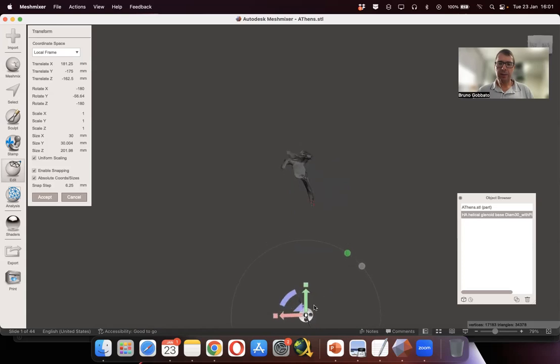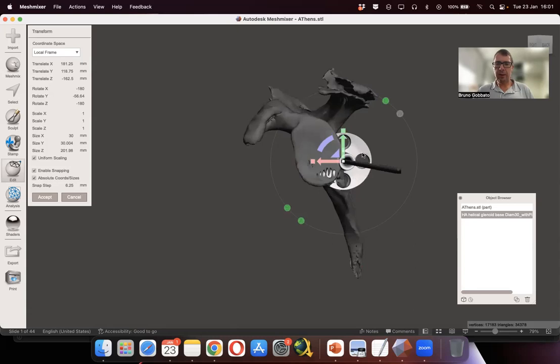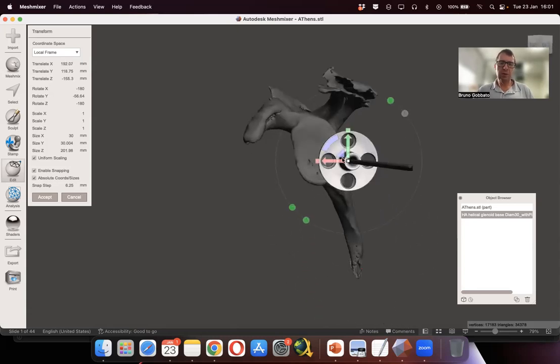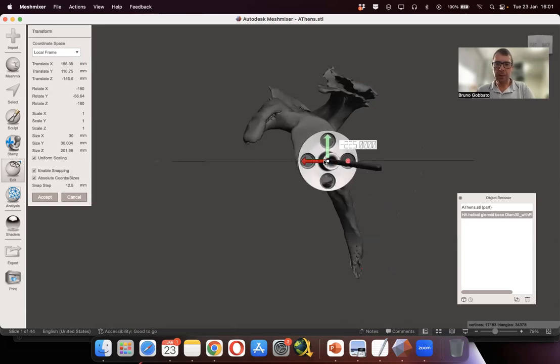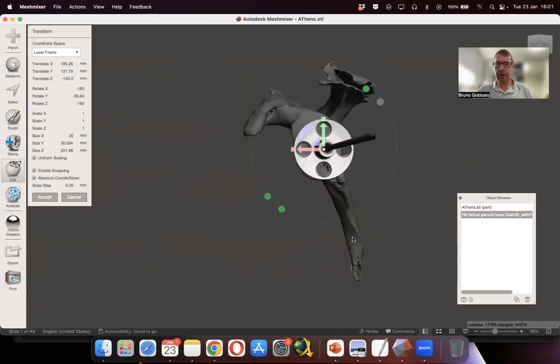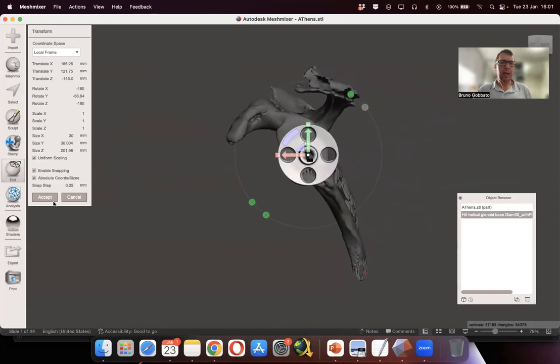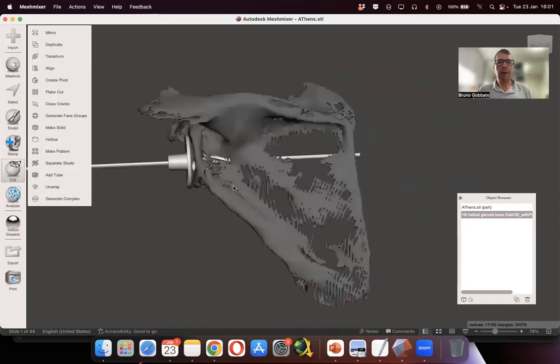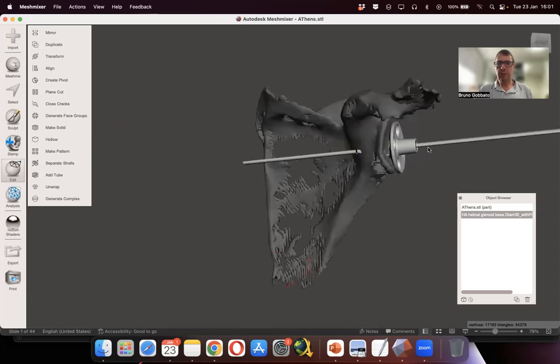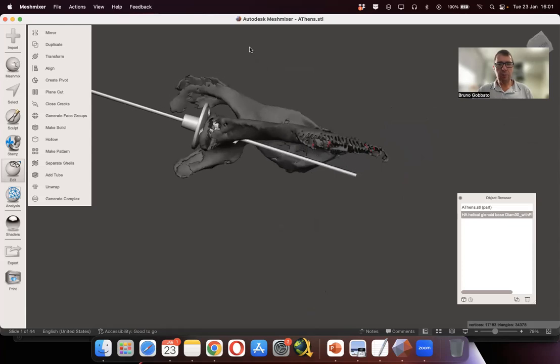As you can see here, it's in the inferior part. So we have to put the implant close to our scapula. This is one of the most difficult parts. Let's move here, let's move here, and let's check if everything is correct. It's almost correct. I'm going to do accept, and now I'm going to check if the implant is in a good position. Remember, this patient is a small patient.